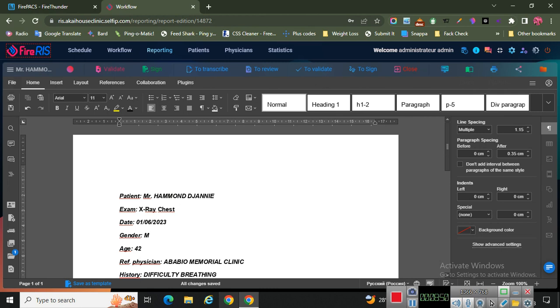So it's basically like a Microsoft Word reporting canvas, sort of. So let's go back.